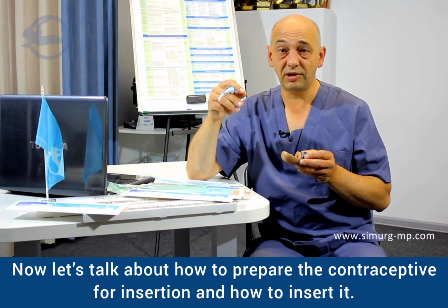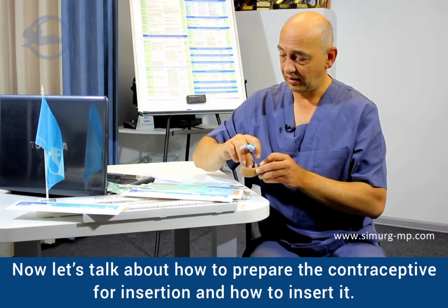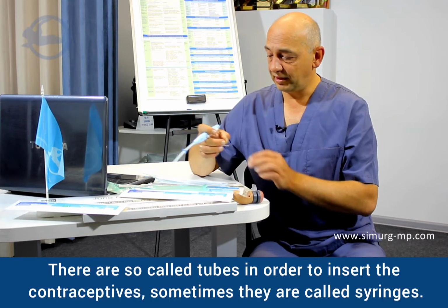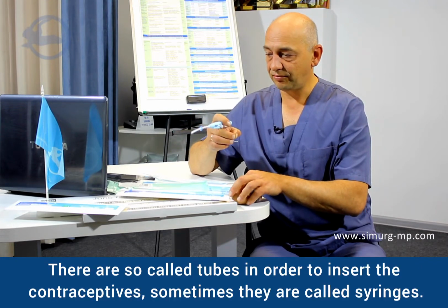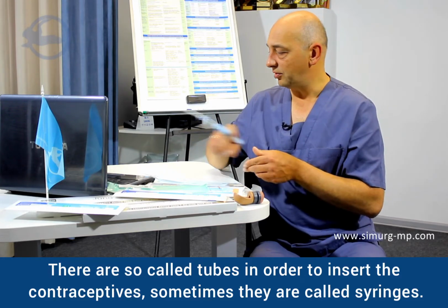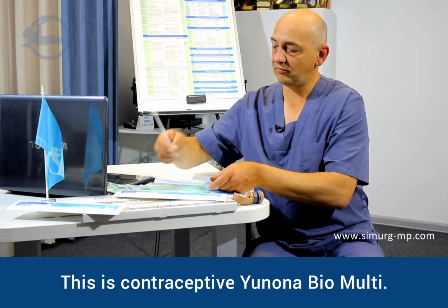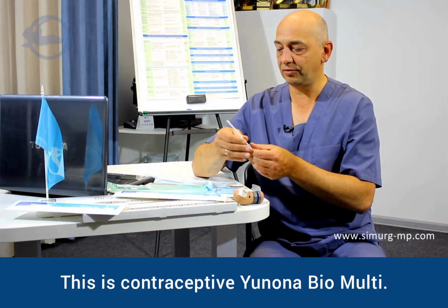Now let's talk about how to prepare the contraceptive for insertion and how to insert it. There are also so-called tubes in order to insert the contraceptives. Sometimes they are even called syringes. This is contraceptive Yunona Bio-Multi.